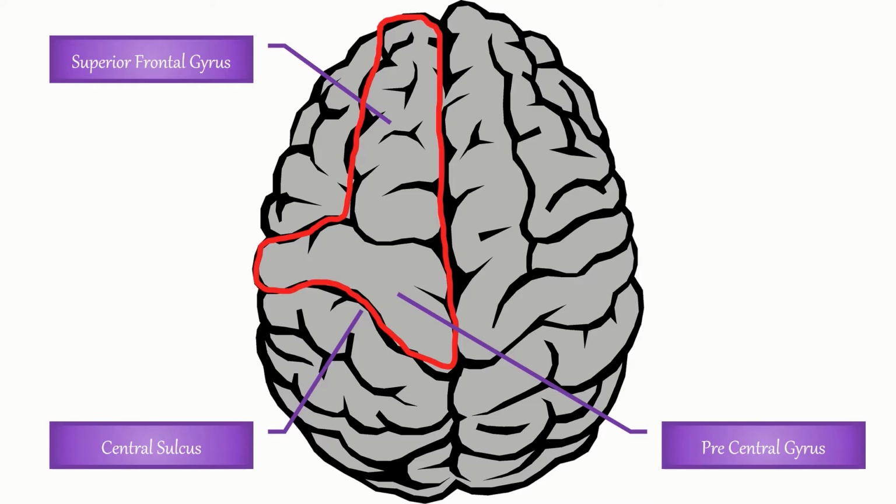That's it. So just use these two signs. The central sulcus is the longest in the coronal plane, and also the upper T sign, in which the superior frontal gyrus and precentral gyrus intersect to form a T, and the sulcus immediately behind this is the central sulcus.